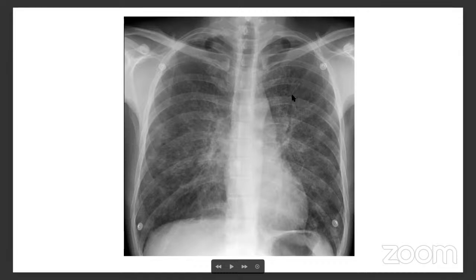As you can see here, it's not like pneumonia with a big opacity, but instead you can see small nodules and small linear kind of things, and the whole thing is filled with that. That's basically perihilar, the central part of the lung. It has a pattern, the same kind of abnormality in the central two-thirds of the lung fields, and there are no separate consolidations. There's no pleural effusion, the density of the hilum looks okay, you can't see any widening of the hilar areas, and there's no cardiomegaly.